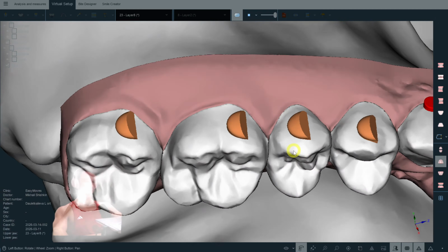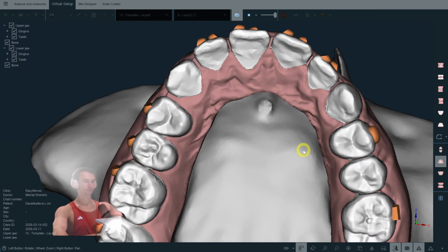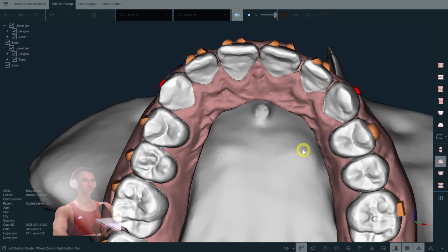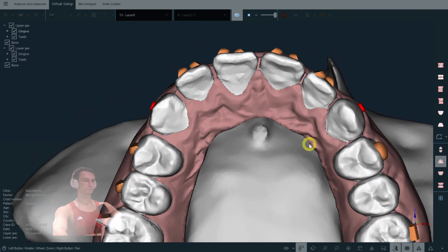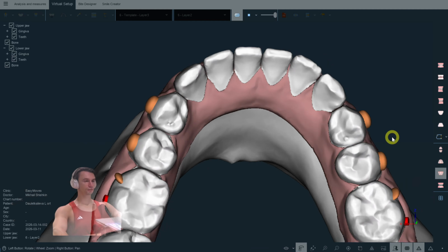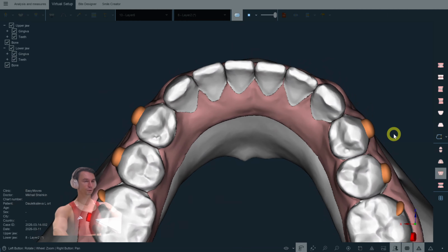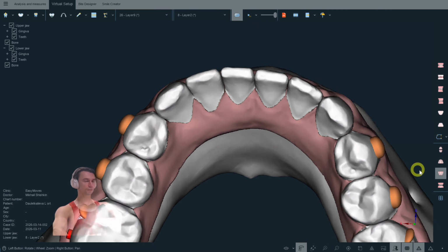Yeah, it's becoming bigger every step, every stage. Stylization and movements of the incisors. Looks good. And the lower jaw is more simple, just some round tripping back and forth.